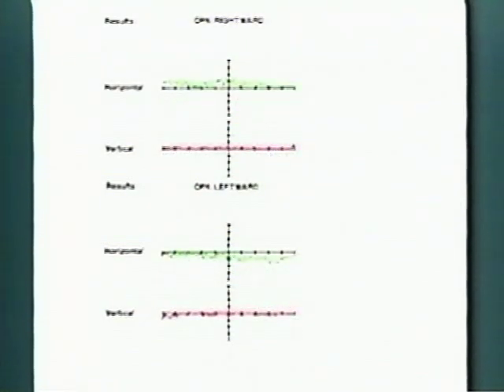In the third example, there is a significant difference of greater than 67% between the rightward beating OPK and the leftward beating. And finally, in the last example, is a complete absence of nystagmus, which, as previously demonstrated, is a clearly abnormal finding. In the case of OPKs, there is no age-related change in the scoring of this particular parameter of the test.